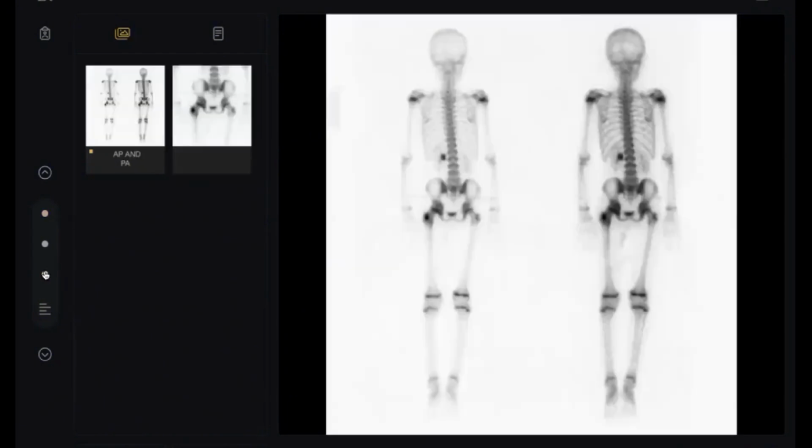For the localized abnormality, I will go directly. I can see that there is increased uptake seen within the proximal part of the left femur bone, and it is surrounded by a lesser degree of uptake. What is the name of this sign? Double density sign. Excellent. Appearances are those of osteoid osteoma. Do you want anything else in this exam?